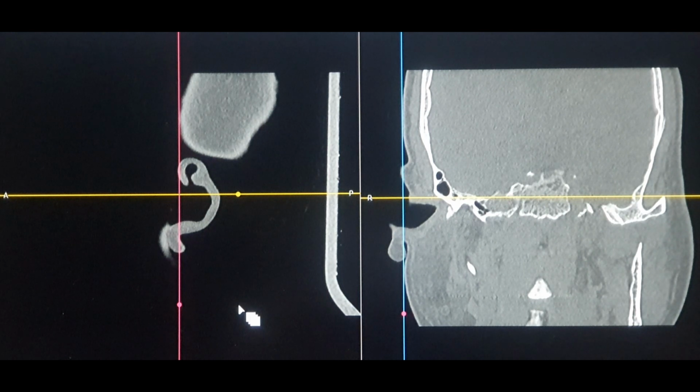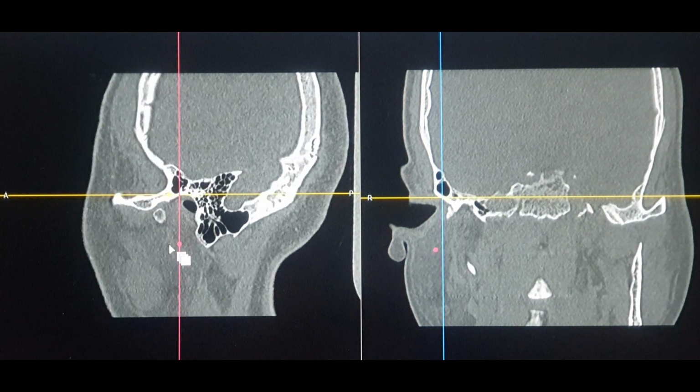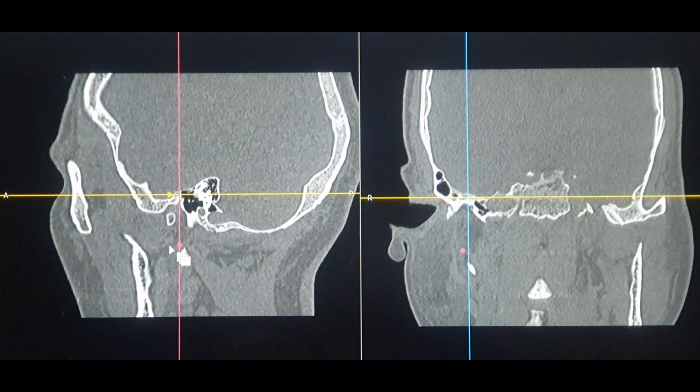They just mention that the lesion is present in this sinus, in this area, but they don't mention the side sometimes. I don't know why. In that case, you need to be extra safe and have this knowledge of which side you are on in the CT scan, okay? So that's the first thing you need to know and study in case of reading a sagittal CT scan.